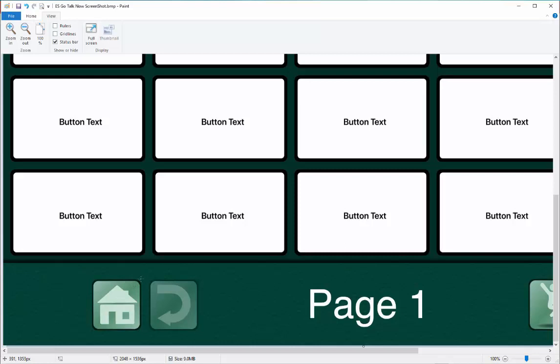Also, the Y value, remember Y is coming down from the top, so I expect this to be smaller than what it is over here. So the Y value, I can even take the measurement here. The Y value here, 1354, should be less than the value here, which was 1493. Just write all this down as you take these measurements. So I'll subtract this value from this value, and when I did that, I got about 139 again. Now, if you said 139, I bet these are really 140 by 140. Yeah, you probably could say that too, and it would produce a fine result.